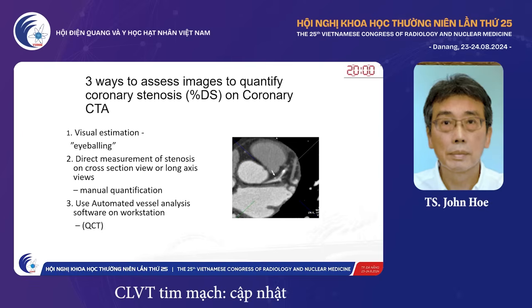The first is visual estimation, or eyeballing, which is what we do every day. You can do direct measurements of stenosis on cross-sectional views or long axis views. That's called manual quantification, or you can use the semi-automated vessel analysis software on your workstation, which is called QCT.